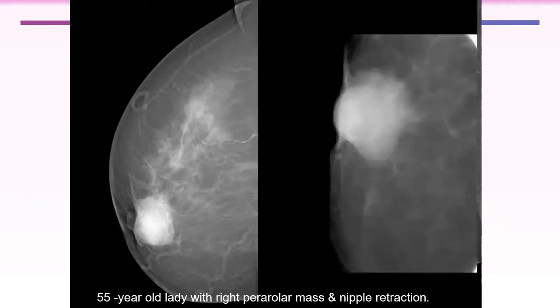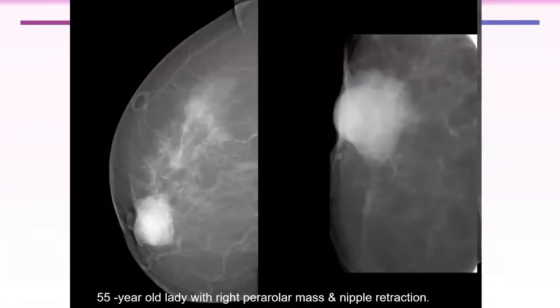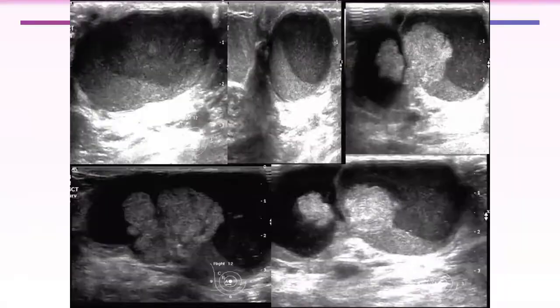Okay. You see, look here. There are flecks of calcifications, and look at the nipple areolar skin and retraction, very obvious in the spot magnification, and the indistinct borders, okay, and microlobulations. So it is a suspicious lesion. This is the ultrasound. What about the ultrasound?